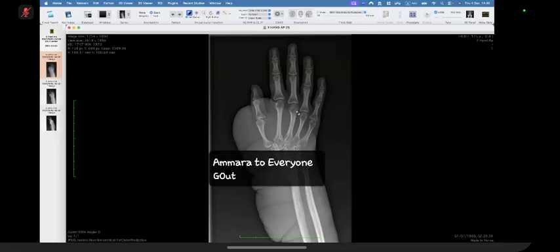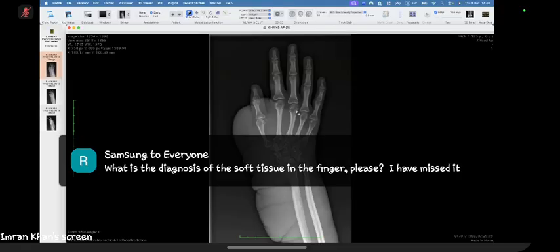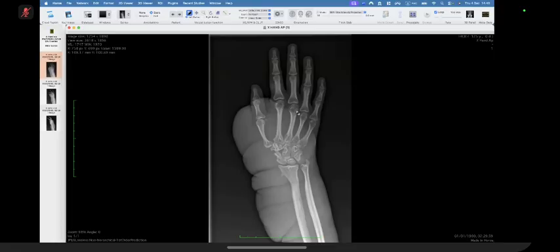I can see narrowing of the shaft of the visualized metacarpal bones associated with irregular surface of the carpal bone and irregularity in the articular surface of the metacarpal joints and the radio and ulnar carpal joints. The texture of the bone is seen normal.